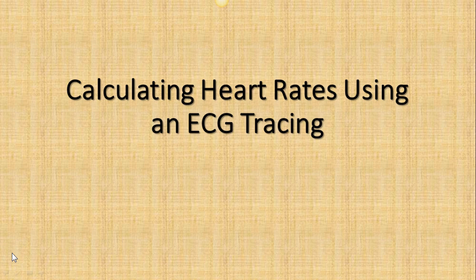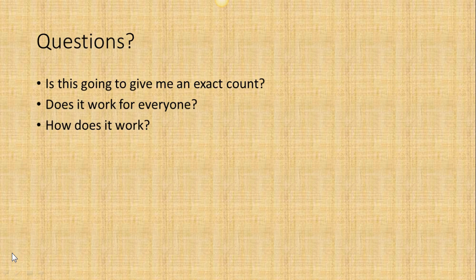When I'm teaching folks how to do electrocardiograms, one of the questions I get asked is, can we calculate their heart rate using the ECG tracing? The answer to that is simply yes. Is it going to give me an exact count? No, because people's heartbeats vary from minute to minute, but it's going to give you a pretty good approximation.